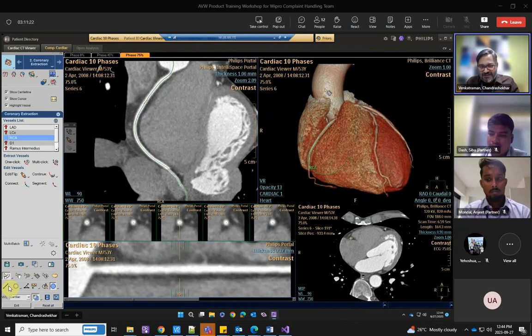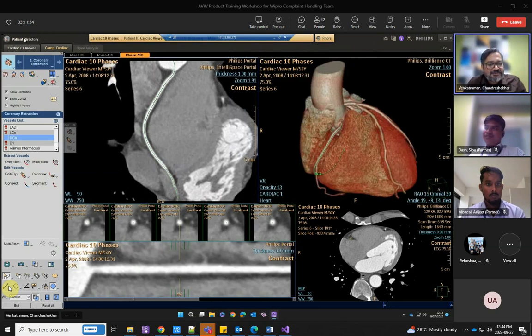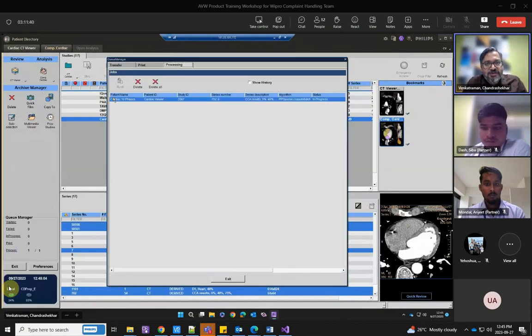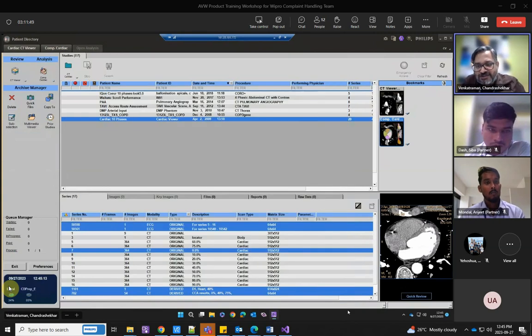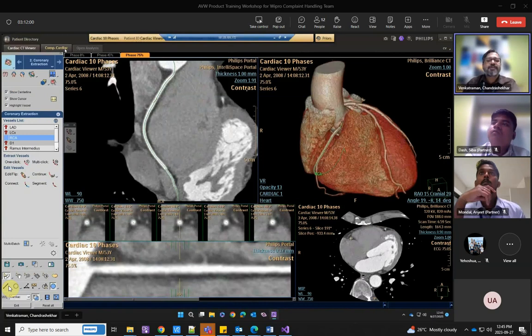So now that you can see, while we were talking, the screen did not actually get logged or anything. I can continue using it. How it saves is it follows this pre-processing path, right, queue manager. The CCA auto batch spooler algorithm runs and creates those batches in the patient directory here. So this is the regular series. Of course, those individual series will also appear shortly, but that can continue in the background whilst you continue using CCA and do your further things.